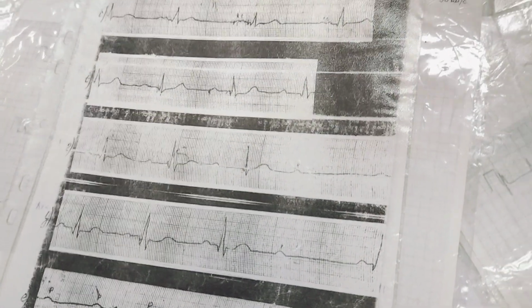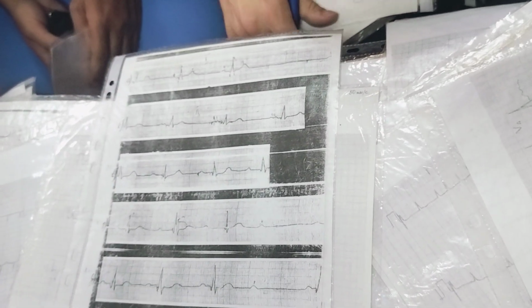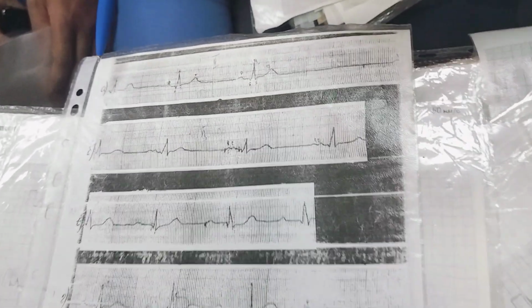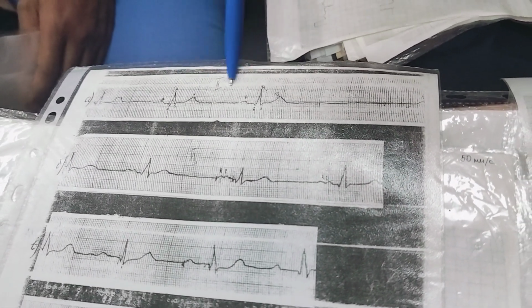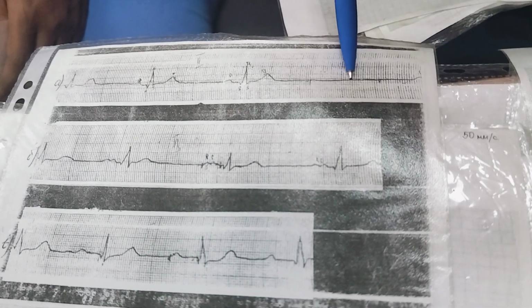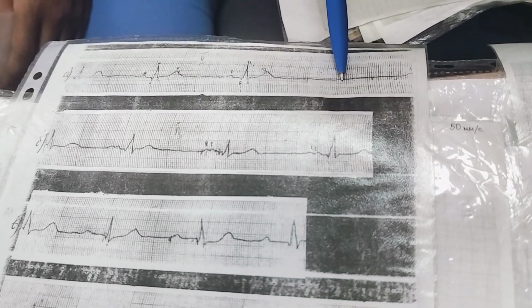This card on the exam is to support the answer heart block. On the control I will not give it to you. Number A is SA block. Distances are similar. Next is a twice longer distance. The PQRS complex disappeared here. SA block.